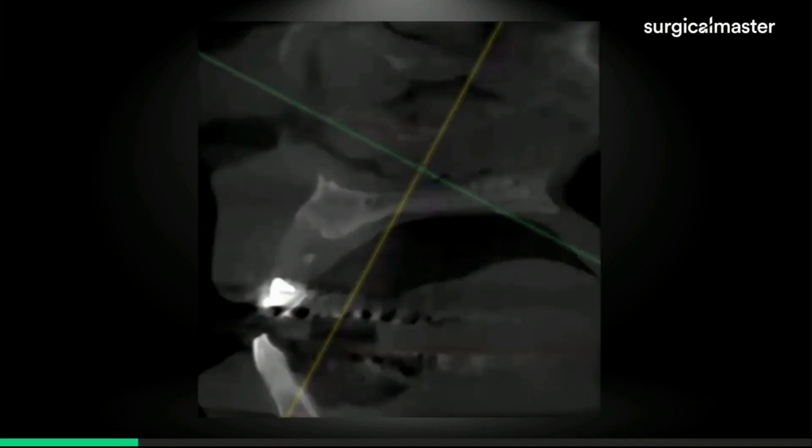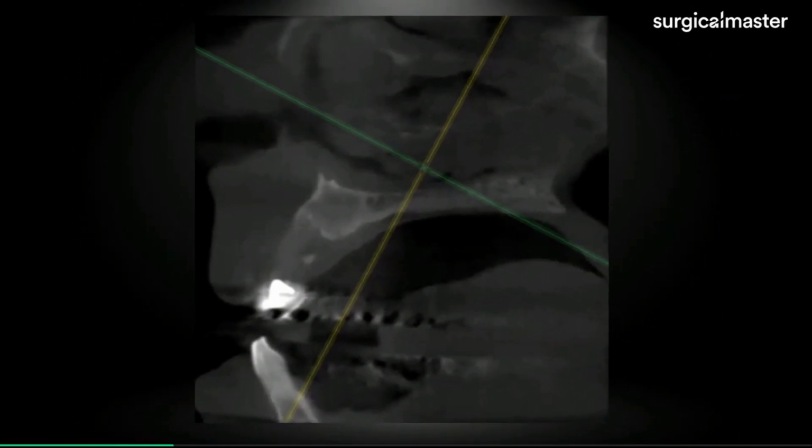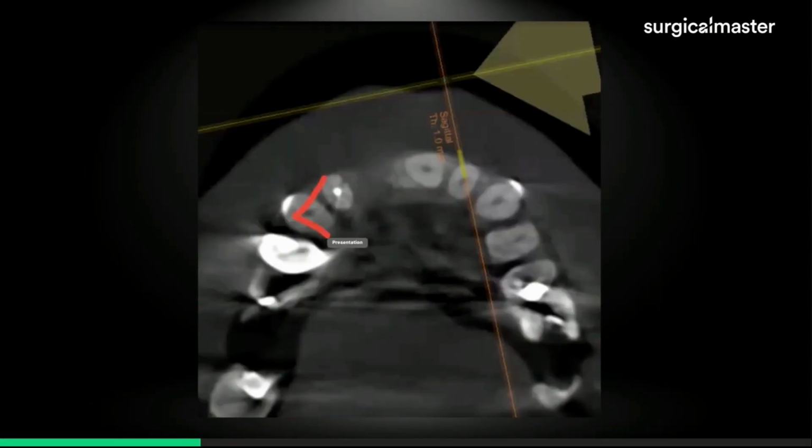It's pretty close. To me, and I'm not sure if the doctor is with us today on this call, this site, if that's the implant site, it's just too deficient to work with. It's definitely not going to be an implant site.